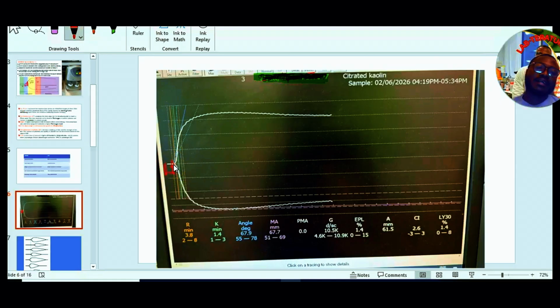Now, immediately the R time ends, the kinetic time begins. At what time will a clot mass be formed which makes a width of 20 millimeters? So let's say it happened over here. At this point, this height is said to be 20 millimeters. That is what we mean. The time from the R time's end to the point where 20 millimeters was obtained, this side will become the K.